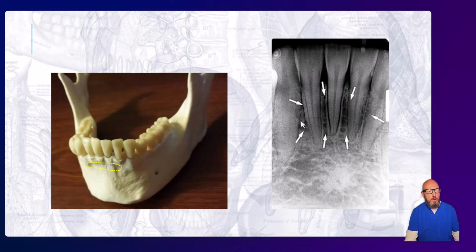What about if you see an ovoid radiolucency like we see here? Does this look like a periapical lesion or other pathology? It has kind of a gradual border to it. And so do I suspect some malignancy, something bad? Well, this is why we need to be aware of these different anatomical structures. And this again is just a fossa or an indentation in bone that happens to overlie the mandibular anterior roots. And so we call that the mental fossa. I always think of mental floss when I say that, so that may help you remember: mental floss, mental fossa.